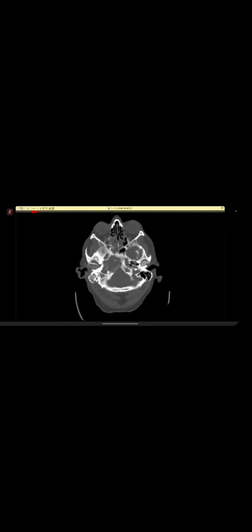This is petrous apex. And please remember that at times in petrous apex, there will be aeration, which can happen as we are going slightly inferiorly. You can already see that this petrous apex is there. This is the carotid canal, and there is a large lesion sitting here. Please remember, it arises from the synchondrosis, the joint between the two. So how it is eroding the clivus, and this is the center, and it is slightly off center.